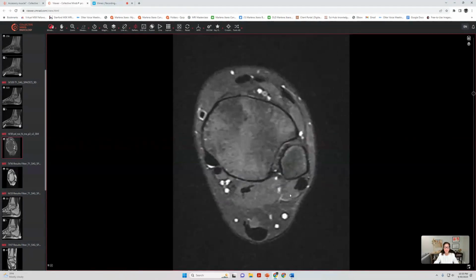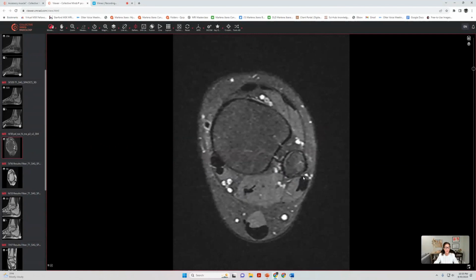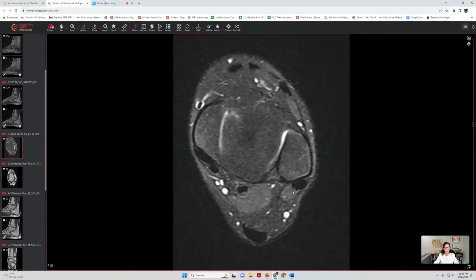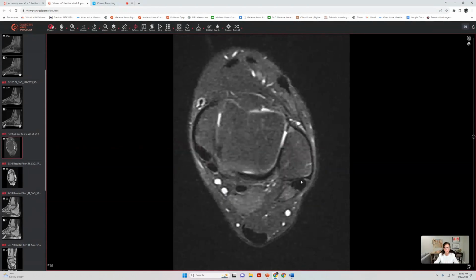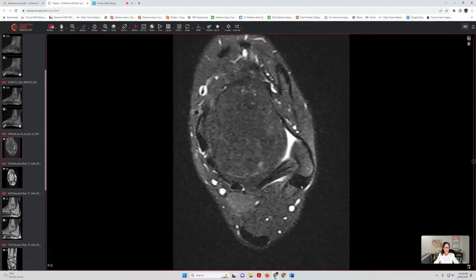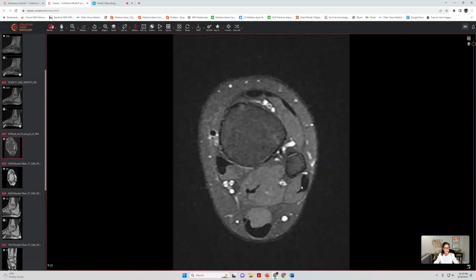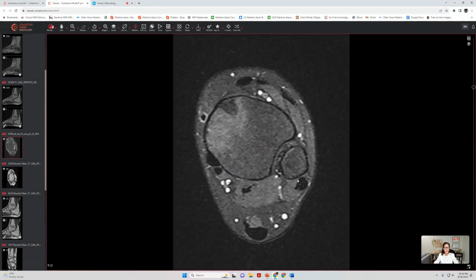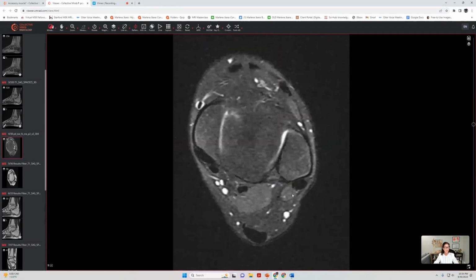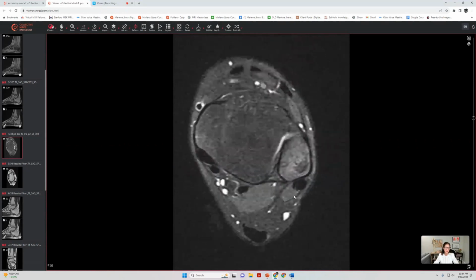Now, the peroneal tendons, we have the peroneus brevis, which is this nice S-shaped structure, sort of the eyebrow between the peroneus longus dorsally and the dorsal aspect of the retromalleolar lateral groove. So that's the brevis in front of the longus to protect the longus, which is a more round tendon. The brevis is actually a flat tendon. It can come in different types of variations. There can be two muscle bellies. There can be accessory muscles. In fact, the peroneus quartus, as we mentioned, is the most common accessory muscle of the ankle.